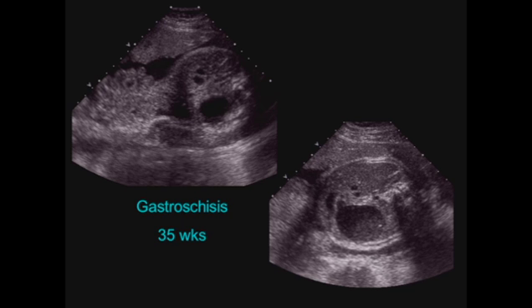So this was an unhappy fetus who is no longer putting any fluid into the gastroschisis loops, and who is now giving us evidence of a possible gastric outlet obstruction. The fetus was delivered that night, and indeed the bowel was navy blue, but at delivery, as soon as the bowel was lifted up straight and the blood flow could be restarted, it pinked right up. Every time they let go of the bowel and let it drop to the side, back to navy blue. So we were lucky enough in this instance to pick up the acute ischemia that was happening in this fetus as the gastroschisis progressed.